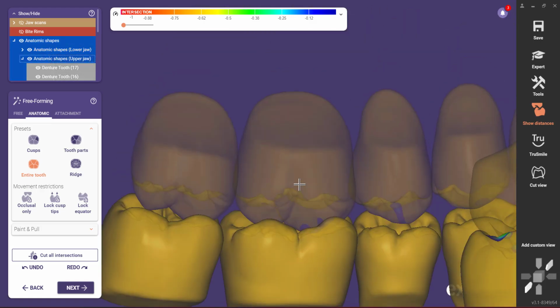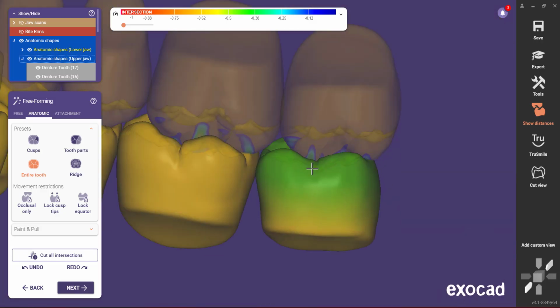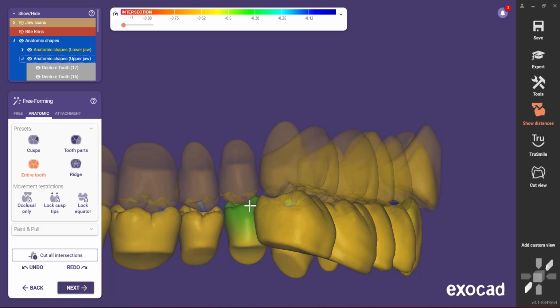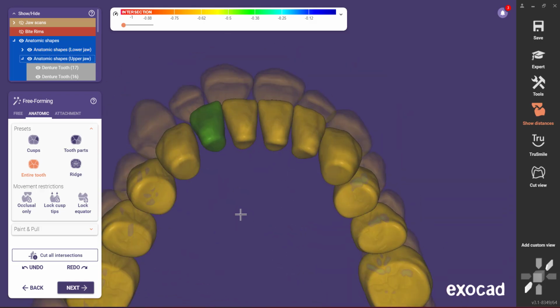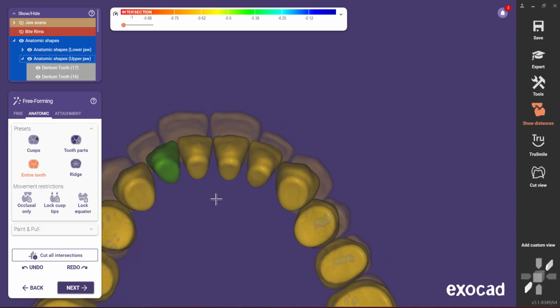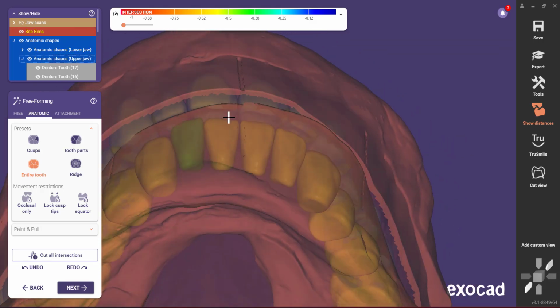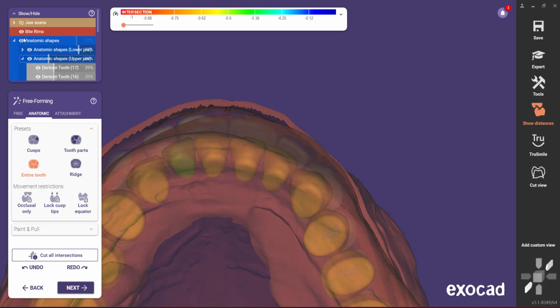Get these where they're partially visible. And again, I don't want to get my mandibular teeth any farther off the ridge than I currently am. And so here I can start tucking back those anteriors, maybe just to reach the mandibular teeth. I still want to make sure I'm staying on track with my midline.